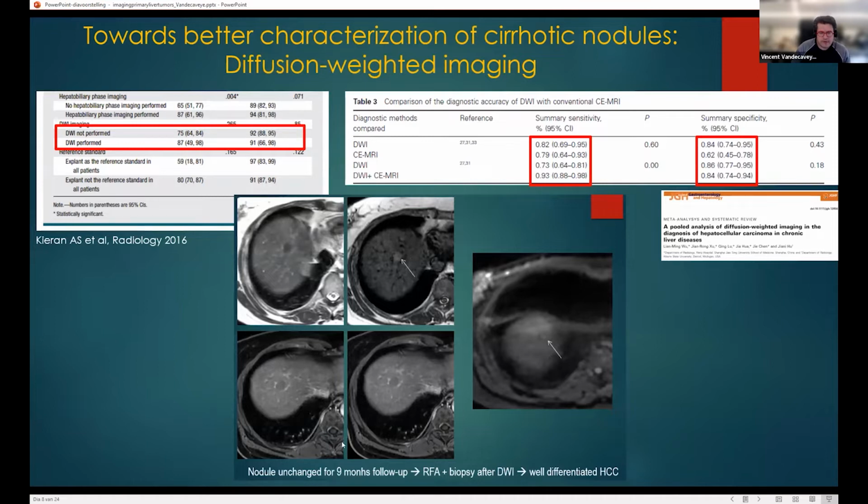When we look at this case, this is in a viral hepatitis. It's a dysplastic nodule, but as you already can see nicely on the T1, and this is what I train my students, look first at all conventional features. And it's what already was depicted by the previous colleagues, pathologists. This is a nodule in nodule.